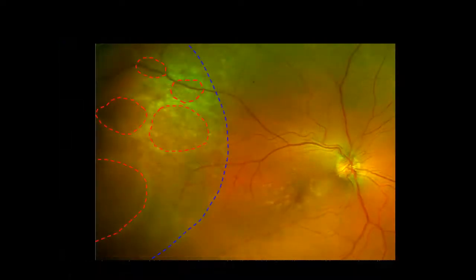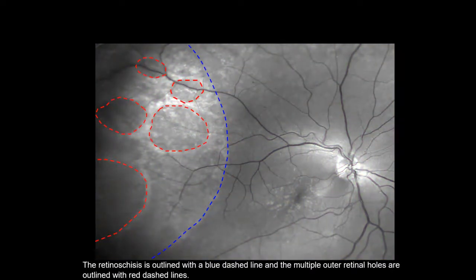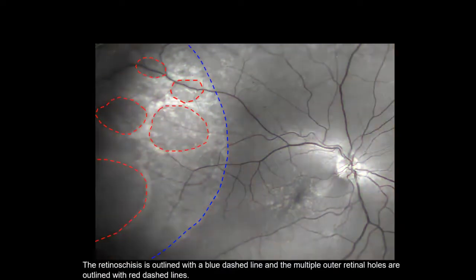So let's outline this. The blue outline is actually telling us about the larger lesions, which is actually a retinal schisis. And the smaller ones, the 5 small ones, are actually something that we'd like to get a little bit more information about. Those are probably something that are related to the retinal schisis. Here we're looking at it in red. We have the color, which was back here, and then we can separate it into red laser separation and green laser separation. That's probably not giving us a lot of information.